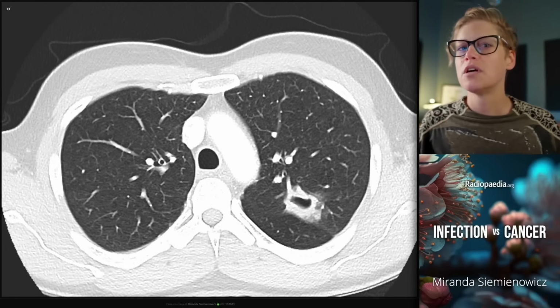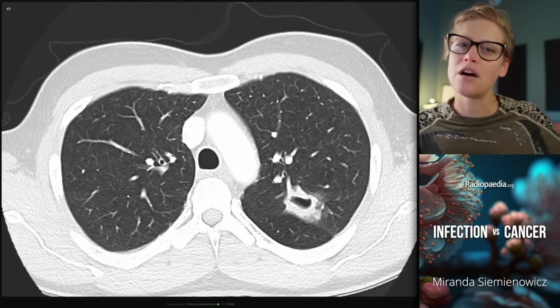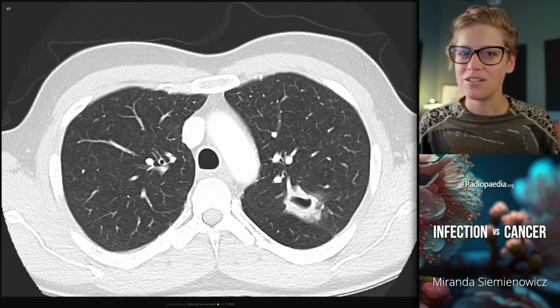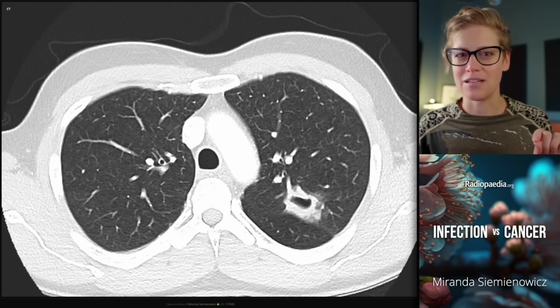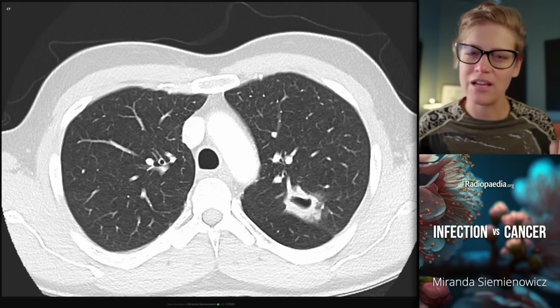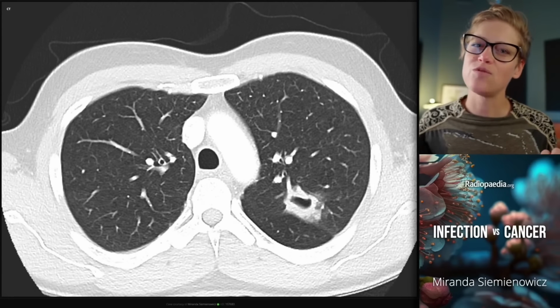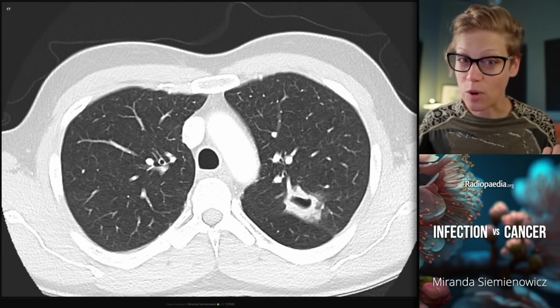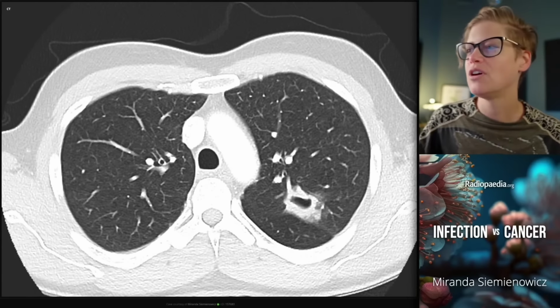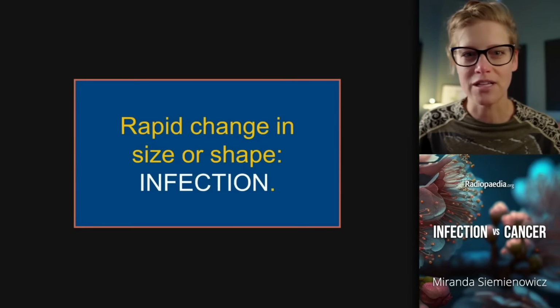That seems like an enormous range, couldn't possibly be of any clinical utility when assessing cases, but just think for a moment about what that means, because what it means is that if you have a volume doubling time of less than 30 days, then infection is much more likely than cancer. Infection is what moves that fast. Cancer only very rarely moves that fast. And when I measure this out, the 2-week CT interval gives me a volume doubling time of 12 days. So this case is here to remind you that a rapid change in size or shape is much more likely to be infection.